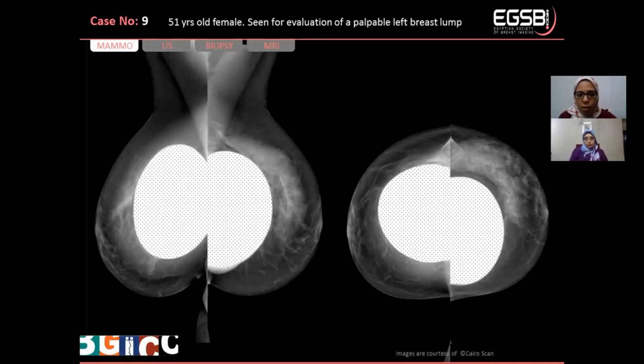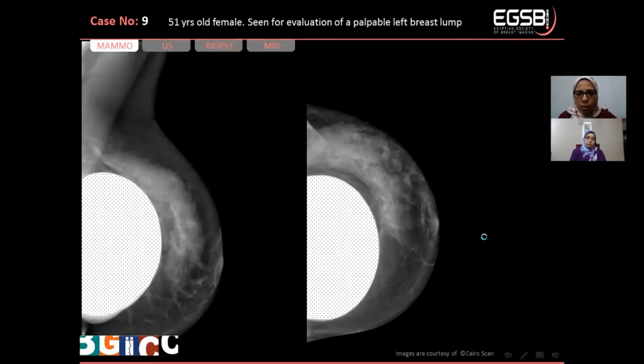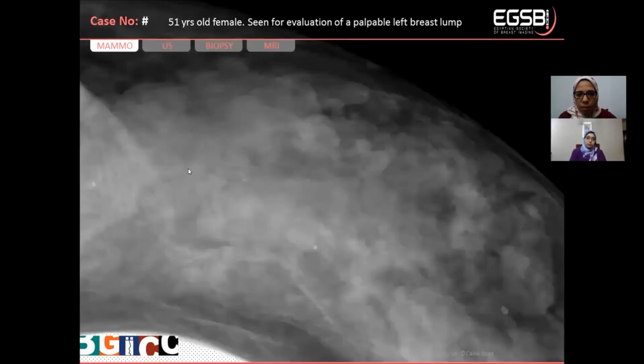These are the digital mammography images of her breasts, showing a focal asymmetry involving the outer quadrant of the left breast. As you can see, this asymmetry is displacing the implants posteriorly and medially in the left breast. As we look closely at this asymmetry, we can see very characteristic nodular densities along this asymmetry, very clearly seen. These are peripheral nodular densities; no calcification or distortion was identified.